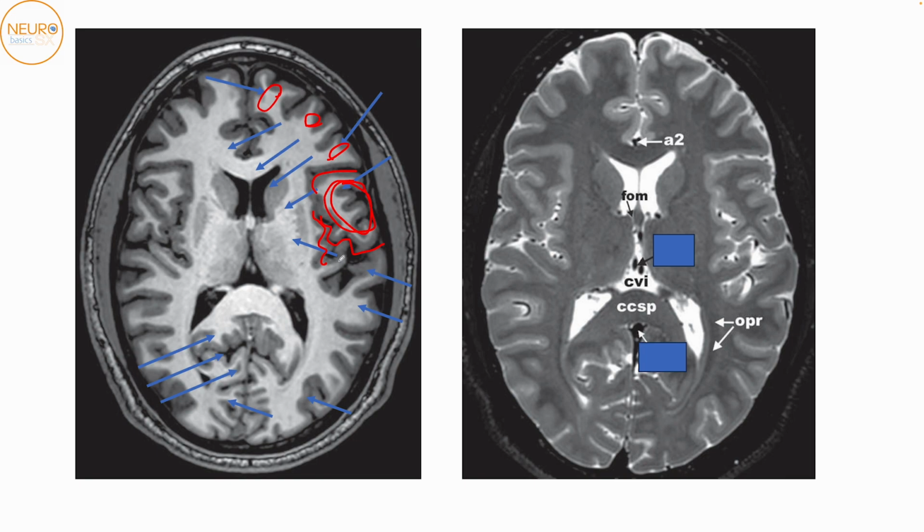Okay. At this point, now that you've reached the sylvian fissure, you will not have the precentral and the postcentral gyrus anymore. Below the sylvian fissure, in this direction, you'll start now getting the temporal lobe. This is the superior temporal gyrus, and this is the middle temporal gyrus. Behind that, you will have the occipital gyri over here. So this is the occipital gyrus. Okay. Apart from that, other very obvious identifiable structures, again, we can still see the calcarine sulcus over here. And behind the calcarine sulcus, as we know, this is the cuneus.